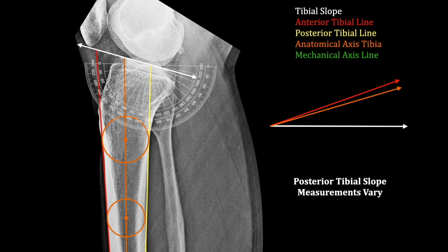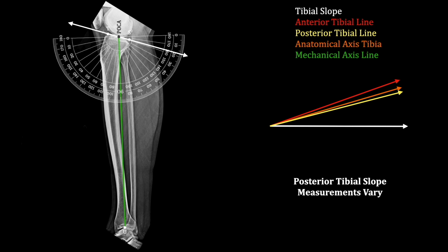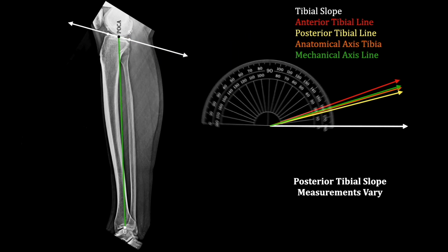The measure of tibial slope differs depending on the reference line we take into consideration. One should therefore be careful while considering the postoperative desired tibial slope according to the reference line chosen. Calculating the degree of surgical correction to be done should also vary accordingly to avoid erroneous results.